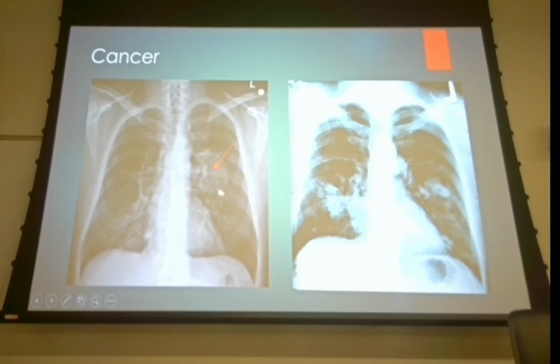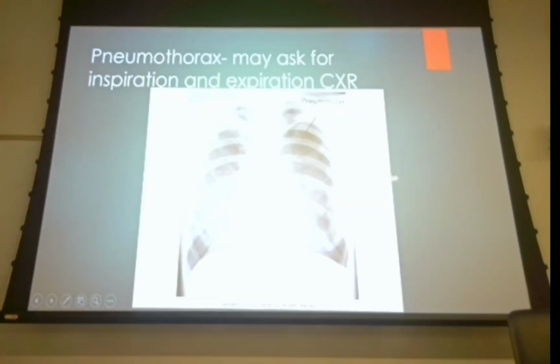All right, so I'd mentioned cancer is pretty subtle. Does that really stand out as something that's probably going to end this guy's life? Not really. The rest of the lung looks kind of cruddy too, but in the scope of things, it's not all that bad. Over here, that looks pretty nasty, right? So hopefully when they catch a cancer, it's not going to be quite that large. Okay. So pneumothorax, this is a quite large pneumothorax.